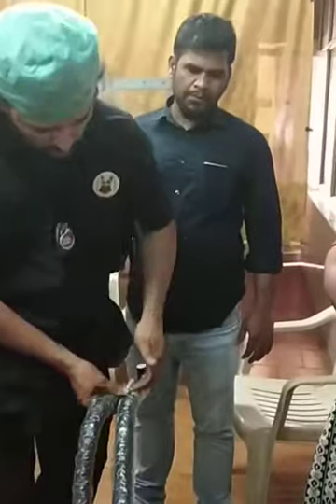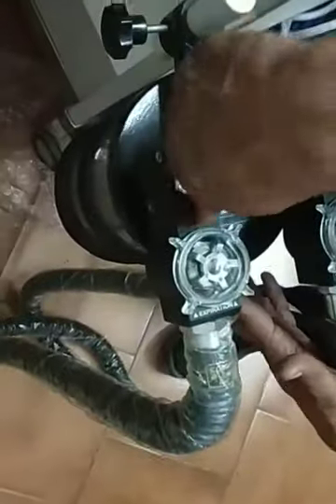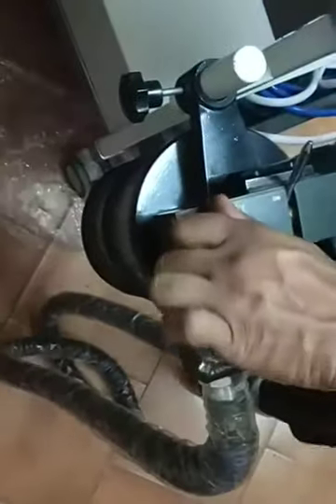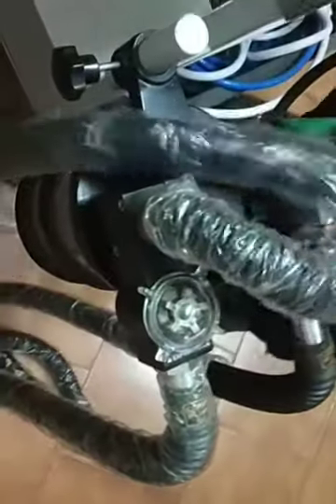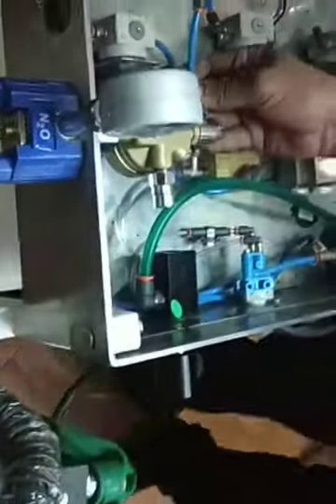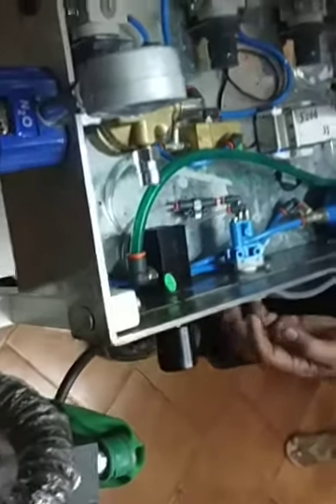The patient gets oxygen, isoflurane, gets anesthetized, produces CO2, this comes over here. From here it goes to the soda lime canister, CO2 gets removed, this is a scavenger valve, and then I can keep the valve open, connect a scavenger hose over here, like this, and have it as a passive scavenger. Okay, now the blue color connections are for the nitrous oxide, the white color connections are specially for the oxygen. This is the emergency flush valve.